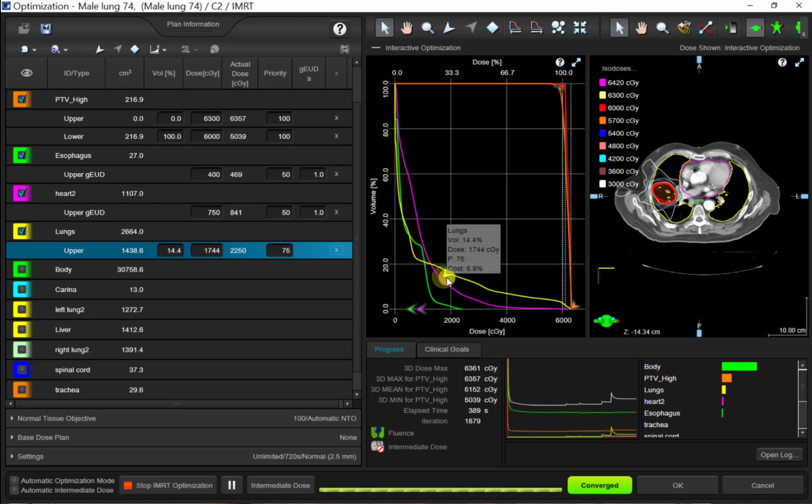It doesn't need it. If we want it to do better on this constraint right here, basically we need to keep up the priority. Or if we want it to do something different, we can pull it down like this. So when I pulled it down, the optimizer all of a sudden realized, oh, it's not very close to meeting that constraint, right? Because I pulled it down. That line is further from that point. So that cost function goes up, starts working harder on meeting that constraint.